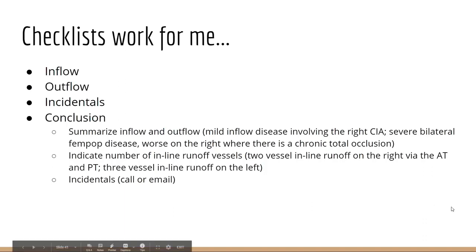And honestly, a lot of times, especially on call, the surgeons may take a while to actually look at our reports, and they'll just look at the images to make a decision. So it's important really to hammer home or to communicate with the physician any pertinent incidental findings.